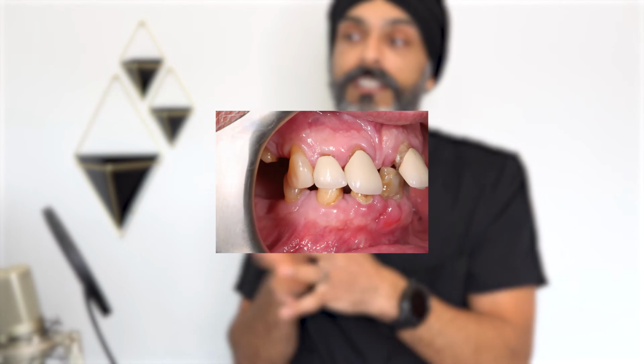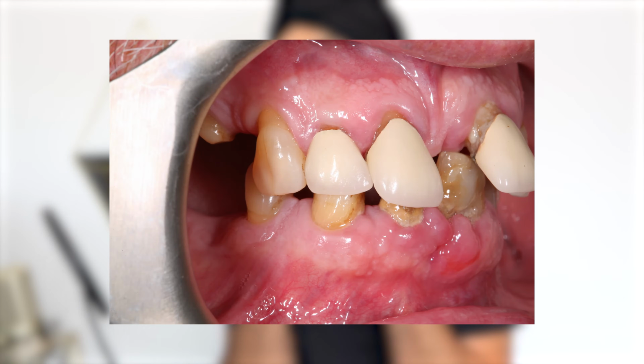Another thing we need to be aware of is that as people lose more teeth, their overlap gets more and more. You can see that's happening here, and this isn't the most extreme case. We've got more extreme cases where the patient's lower teeth are touching the upper gum. Basically, as teeth are lost, the other teeth are jiggling and moving, and the distance between the nose and the chin gets shorter and shorter. We call this the lower face height.